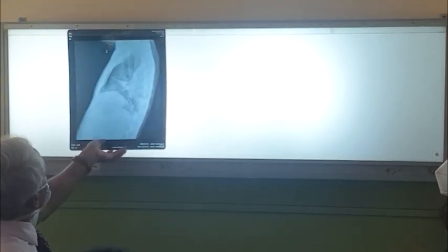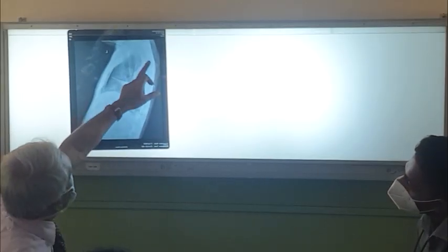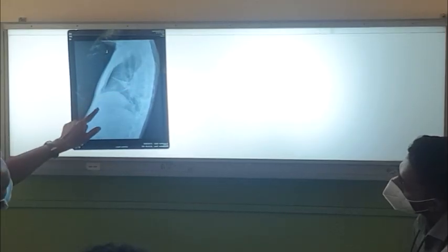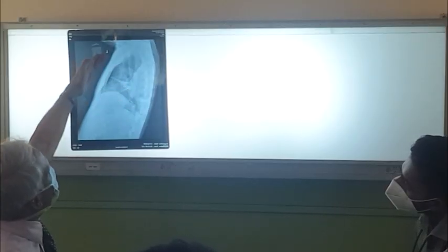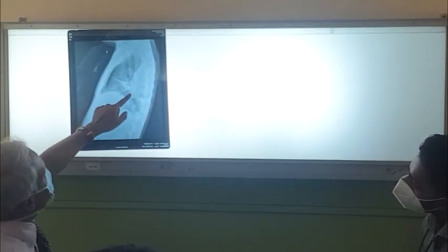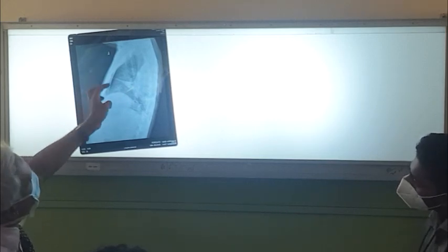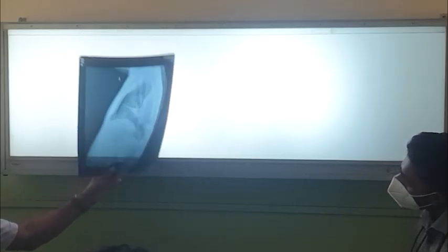This is just to show you encysted fluid, with transverse fissure fluid and oblique fissure fluid. So this should be the right side. The right side has the encysted fluid, although they have done a left lateral. So right is this, right? So it's the right sided encysted fluid here with fluid in the oblique fissure, and you can nicely see the fluid in the fissure. That's why I'm keeping it here, and this may be some tablets.